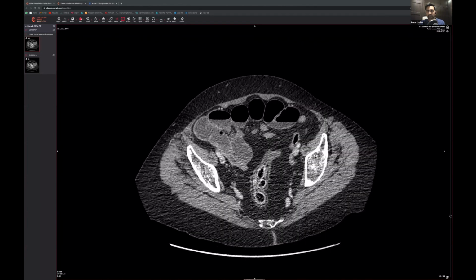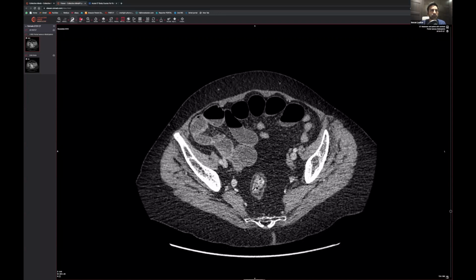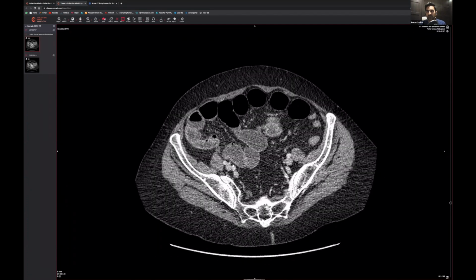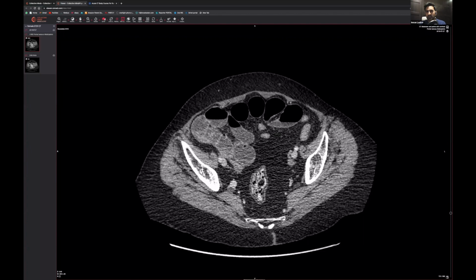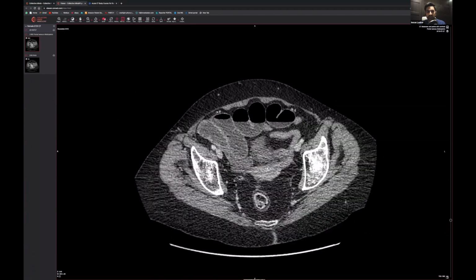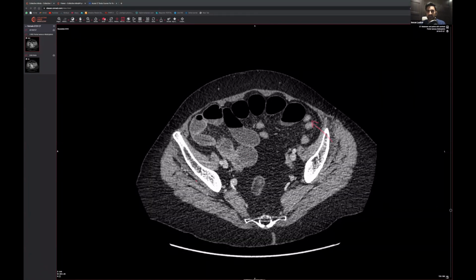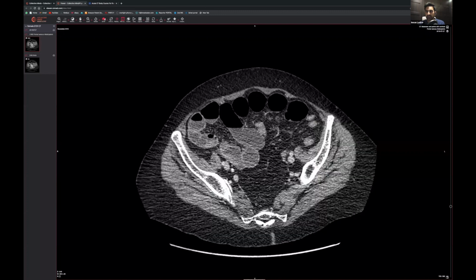No answers yet. So we're coming up to here. Let's scroll to make it slightly easier for me. So going this way, you can see that's more colon that way, but it kind of veers off, doesn't it? Where does it go? It goes this way, I think. Back that way, then it goes across this way, and then upwards, doesn't it? Yeah, upwards. So if you're ever lost on a CT scan, try and use the constants, the descending and the ascending colon. Ascending will be here, descending will be somewhere here. So I reckon this is the ascending colon along this way.